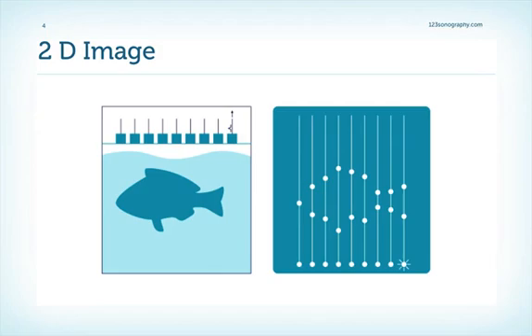But first, one step back. We have to understand the principles. In the previous chapter, we discussed how the ultrasound wave is reflected when it hits a boundary. But how can we now build an entire image with the help of ultrasound? Well, to do that, we need not only one transducer or one crystal, but we need several, many as a matter of fact. And each of these crystals fires a beam and then waits if a reflection and when the reflection returns. And it does that one after the other successively.